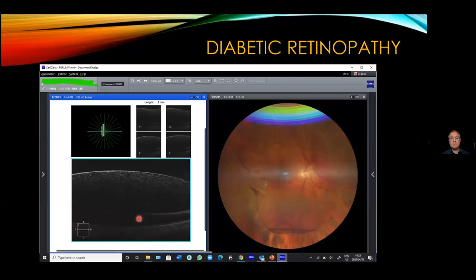cause macular edema. So in this case, as soon as I get the vascularization under control, I will be doing a vitrectomy, removing the blood, removing the vitreous that is pulling, and treating this focally with argon laser.